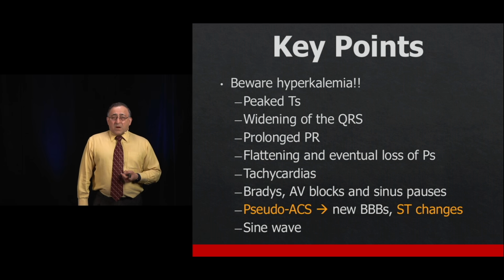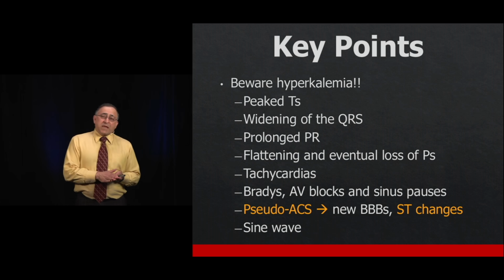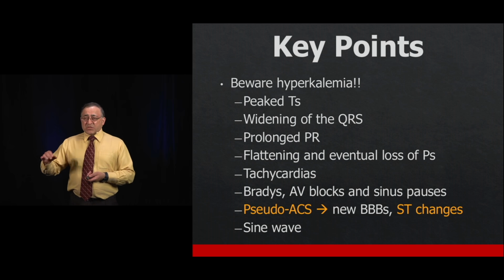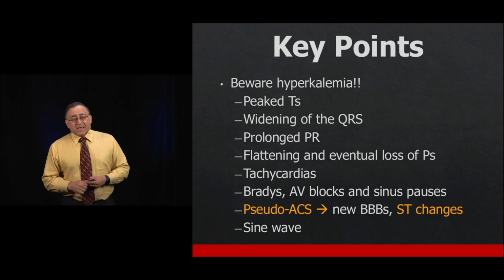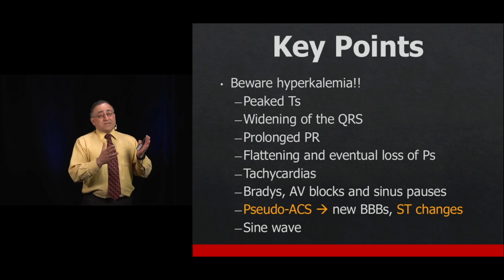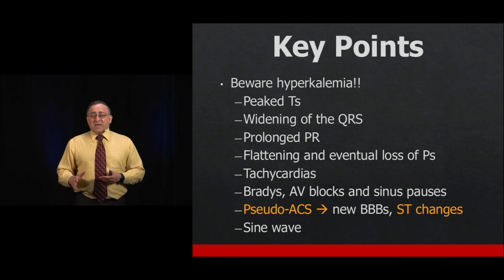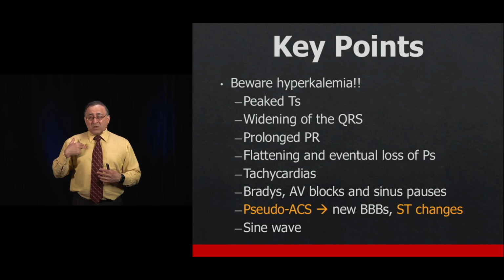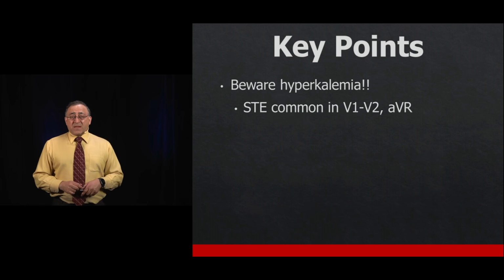All right, so key points. Beware hyperkalemia. We've talked about hyperkalemia in other lectures. Hyperkalemia can do a lot of things to the EKG, but one of the things that is not often taught is that hyper-K can produce ST segment elevation. But the good thing here is that when hyper-K does produce ST elevation, almost always it's in the rightwardish leads, V1, V2, aVR, and you'll often get a rightward axis as well. So keep that in mind.